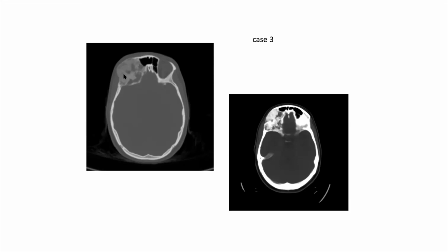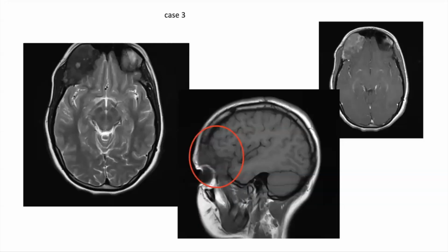There are some areas where you don't see the ground glass appearance. So fibrous dysplasia is frequently inhomogeneous. Fibrous dysplasia also has this unusual feature of enhancing, and in my opinion, looks a lot like metastatic disease, because you'll notice that there's also this loss of the fatty marrow in that space. And here you see on the T2 weighted scan a few of the cysts. So again, this is a close call.